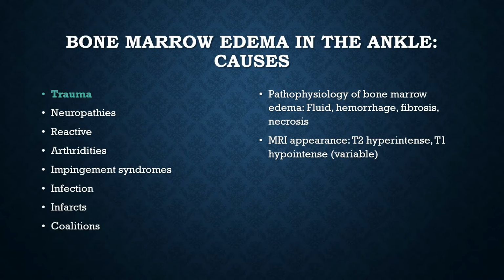There are many causes of bone marrow edema in the ankle. On some of these slides, I will list some additional non-traumatic causes, but the traumatic cause will be highlighted in teal, as you see here.